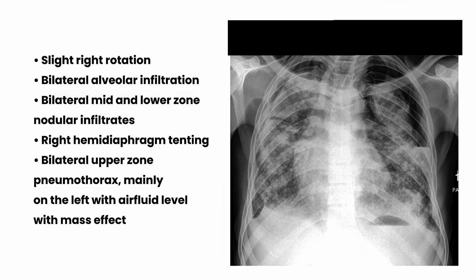Okay, just to recap again, when we are writing a report, first and foremost, we systematically look at the image and different aspects: the chest wall, the mediastinum, the cardiac shadow. So each issue you find here, you can record in a systematic way before you compose a report. So that, ladies and gentlemen, is the report for that image.